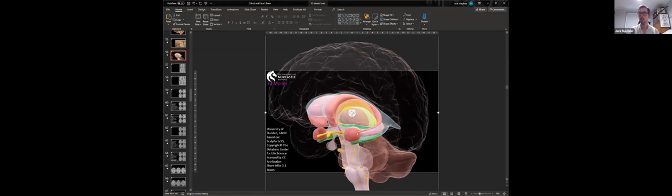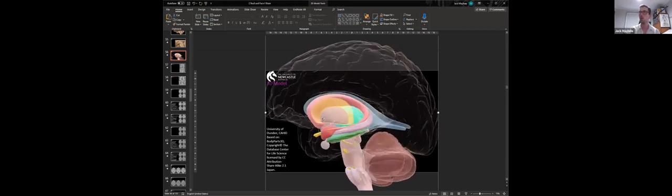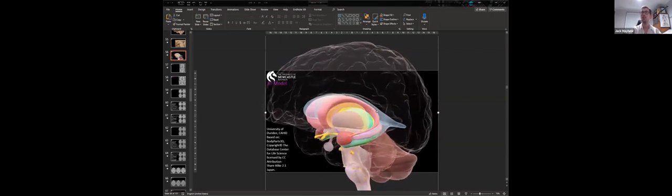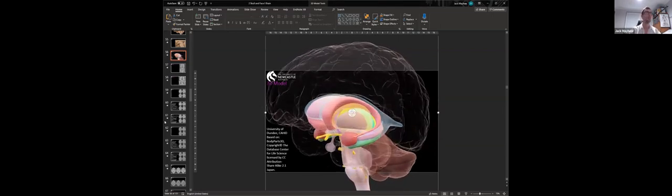But anterior to that tail is this large red area, which is the amygdala. And we can also see this rough shape of the hippocampus. So I completely understand. It's pretty difficult to differentiate the amygdala and hippocampus on singular coronal images, but there is a subtlety in their difference of position.